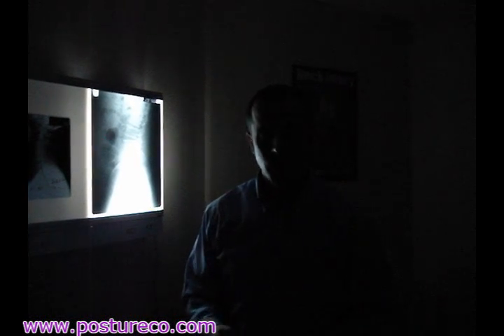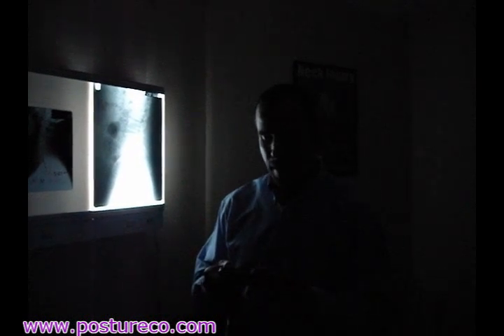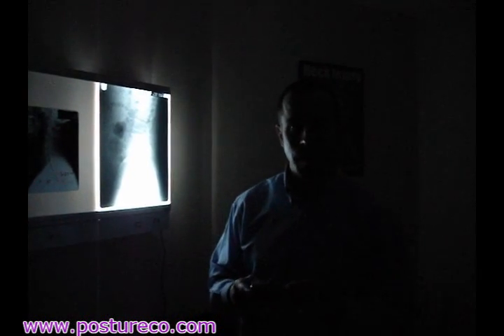Now, I can't offer you support on every digital camera. I simply don't know how to use a lot of these digital cameras. I know how to use the Sony CyberShot. That's one of the cameras that we recommend. We currently use a 3 megapixel camera. We just recently upgraded to a 10 megapixel camera, which right now is recording me on the other end. So this is one of my old cameras right here. But on the old camera, I'm going to go ahead and turn off the flash, which I just did.